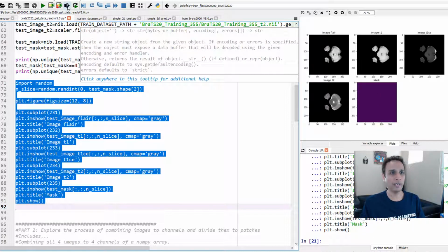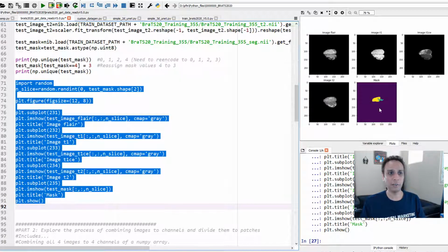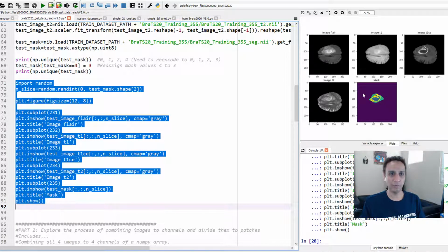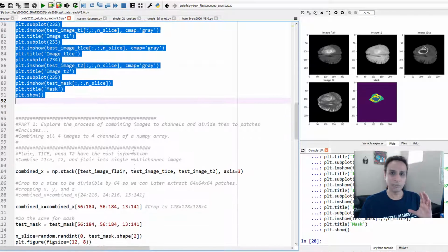Let's do another random plane. Again, no label here, even though you have some data. No label there. The actual labeled parts are very minimal. So let's keep doing this until we find something useful. I'm again randomly plotting some of these planes. Yeah, you have some label right there. There you go. That's a very useful volume, right here if I can crop it. Okay, so far we got some understanding.